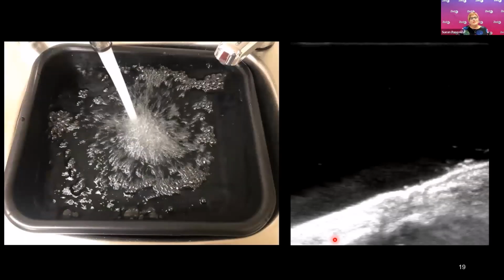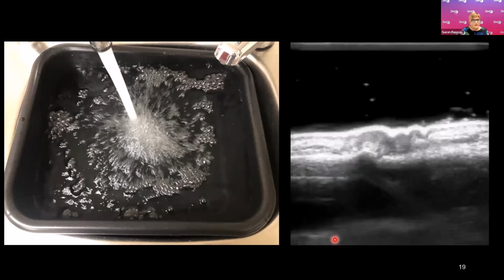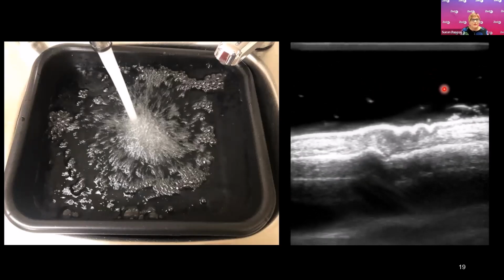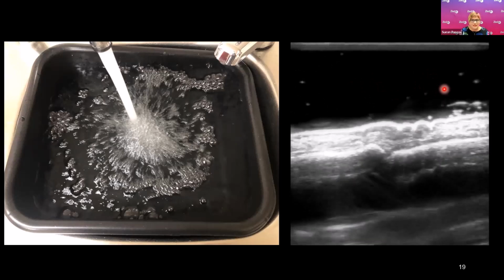It's really important as you fill the bowl to remember that our taps are mostly really aerated now. So if I turn the tap on full to fill the bucket up quickly, I'm going to get lots and lots of air bubbles in my water. And you can see them just floating around. These little white echogenic flecks here are the air bubbles floating in the water.